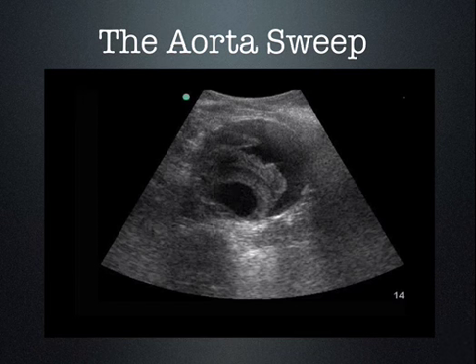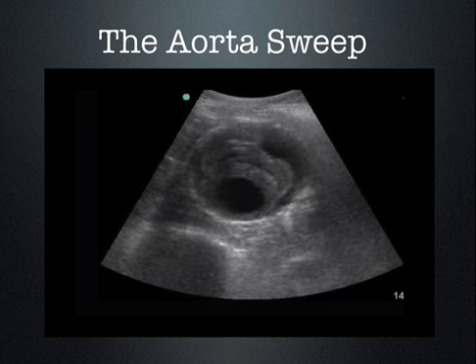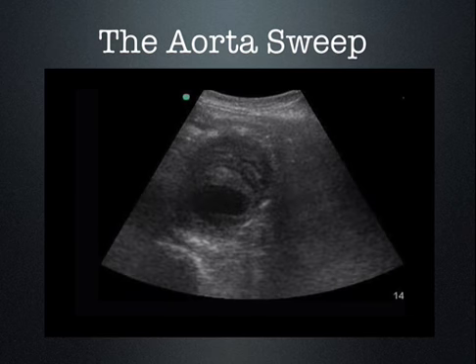On the other hand, if you see this, you've got a problem, okay? This is an aortic aneurysm, and this is a true lumen. This is all mural thrombus here, and then you've got a little bit of blood that's still collected here. Now, if you ever see this in a patient who is coming in shock, even though you're not going to see free fluid, remember, it's a retroperitoneal structure. Ultrasound cannot identify retroperitoneal free fluid. You treat it as a ruptured AAA. Okay? You treat it as a ruptured AAA.